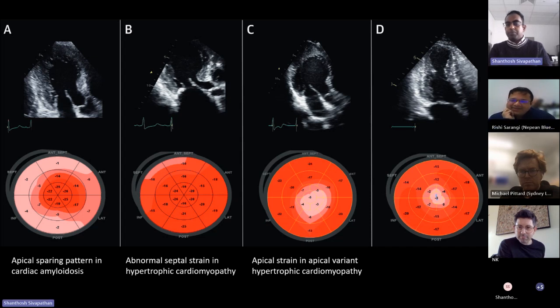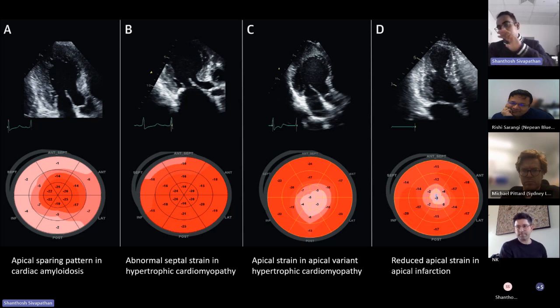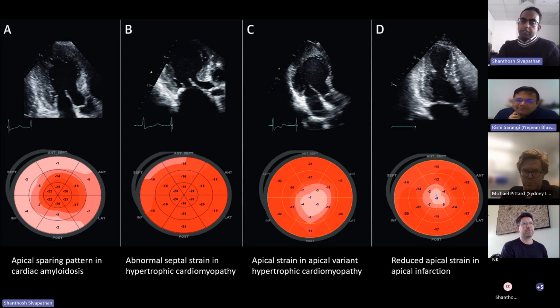Kind of similar to the one previously. It's a mid-ventricular cavity obstruction kind of thing. This is kind of what we talked about before. You get a bit of blue in there. You've got this apex, and I think it is aneurysmal in that segment. So this is in keeping with where you've got an apical infarct or LAD or mid LAD infarct.